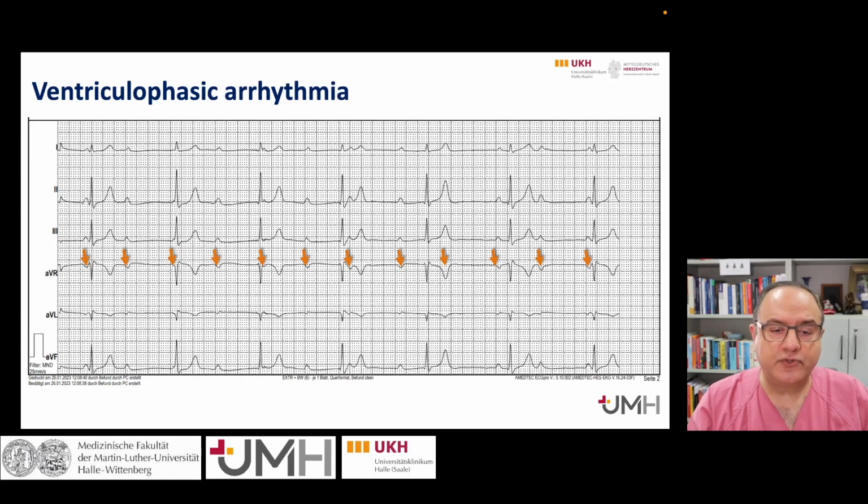First, positive chronotropic effect is defined as sinus rate acceleration brought by ventricular contraction and has two mechanisms. One, the stretch of the right atrium caused by ventricular contraction, which augments the sinoatrial node automaticity, and two, increase in blood supply to the SA node initiated by ventricular contraction, which accelerates sinus rate and shortens the PP interval interposing a QRS complex.